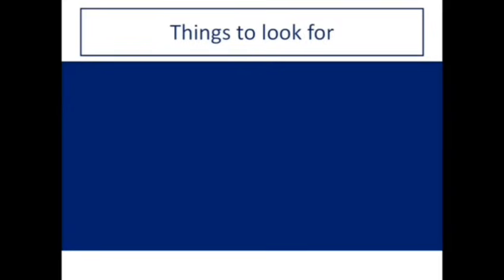Okay, now let's go through an approach to abdominal X-ray and discuss some pearls as to what you need to be looking for each step of the way. There are other videos and resources out there that go through an approach that may appear to be more detailed, but this one has everything you need to look for and is super easy to remember. First things first, of course, you're always going to start by assessing the quality of the film. This includes looking at what views you have, making sure that the whole region of interest is included, making sure it's the right patient, etc.